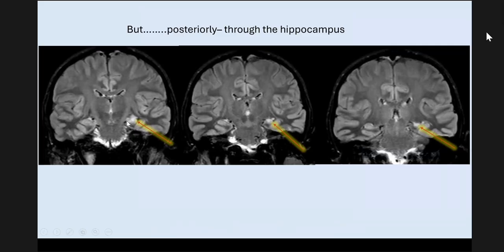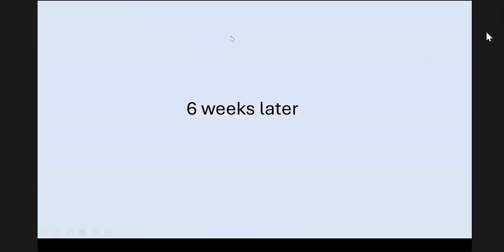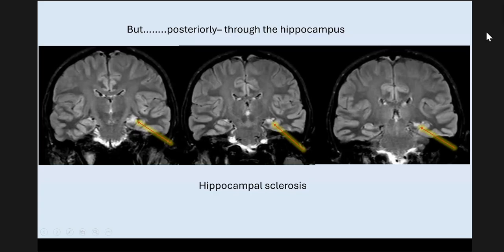And you can see the T2 hyperintensity in the left hippocampus. And in addition, you have also got loss of volume. If you compare with the right hippocampus, the left hippocampus is very much shrunk, very much shrunk. Okay. So what's going on here? Any thoughts? So this is hippocampal sclerosis, of course. The changes in the amygdala, do they belong to this particular entity?